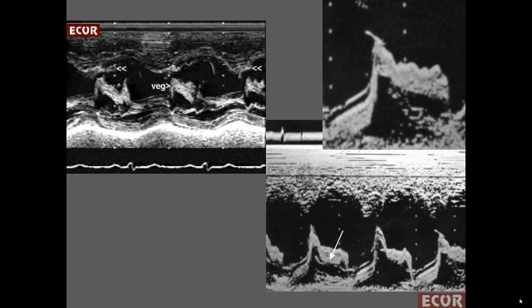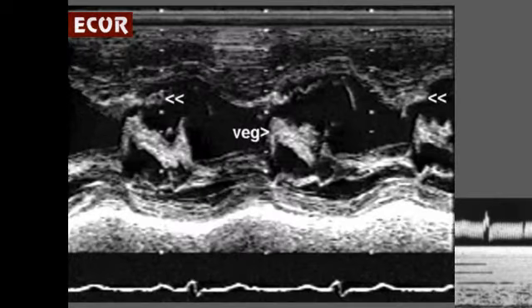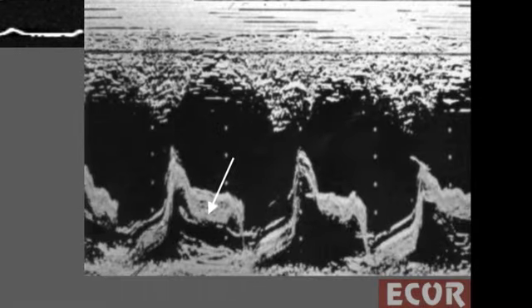Here is an example: infective endocarditis in the mitral valve and in the septal wall, probably in a false tendon. Look at the characteristic findings here at the valve. Notice that there are no lines here or there. Instead of lines, there is a smudge.